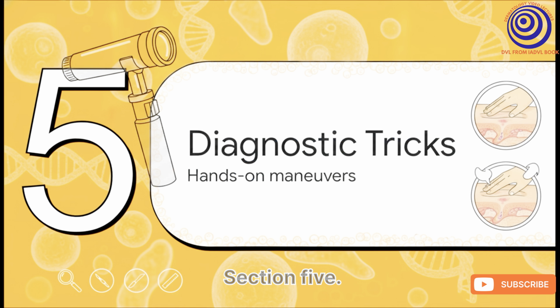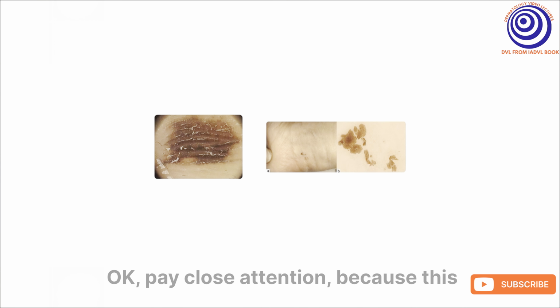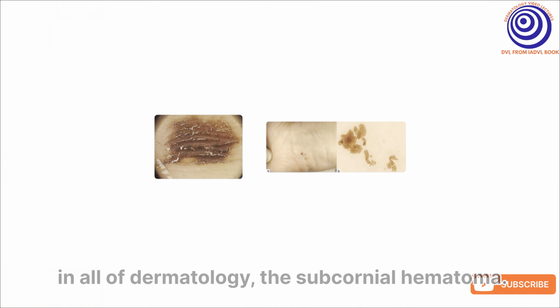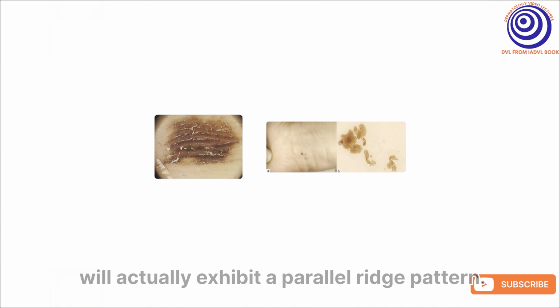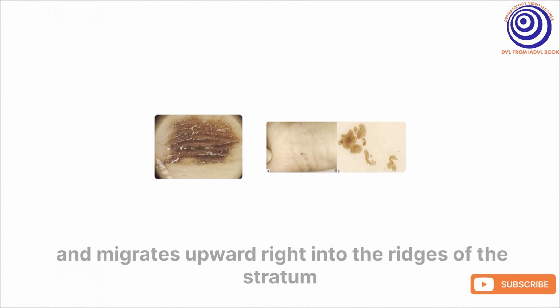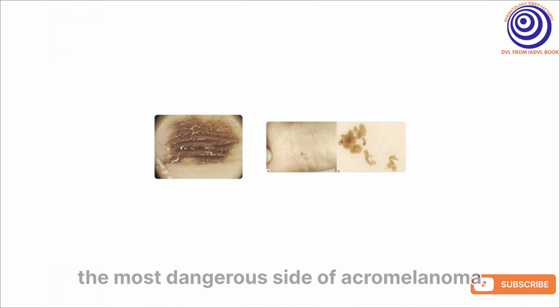Section 5, diagnostic tests and tricks, hands-on maneuvers for the clinic. Okay, pay close attention, because this is one of the most notorious diagnostic pitfalls in all of dermatology, the subcorneal hematoma. Often resulting from trauma, think sports-related injuries like talon noir, up to 40% of acral hematomas will actually exhibit a parallel ridge pattern. Why? Because the extravasated blood pools in the intracorneal layer and migrates upward right into the ridges of the stratum corneum, literally perfectly mimicking the most dangerous sign of acral melanoma.